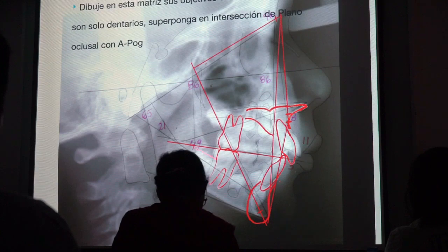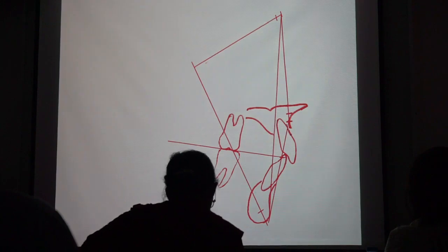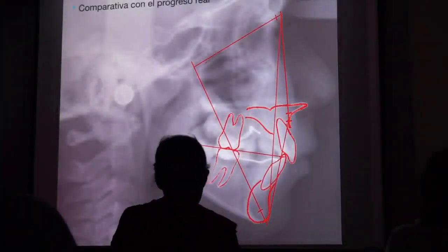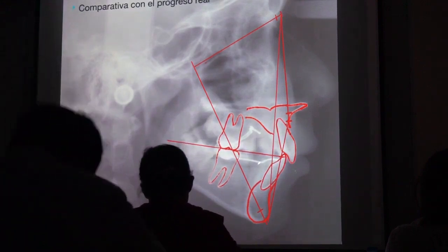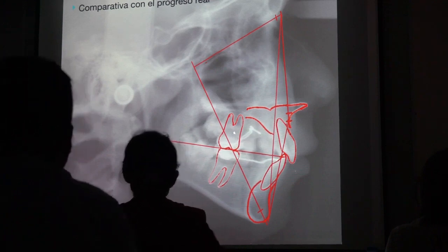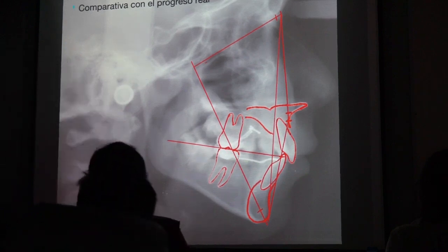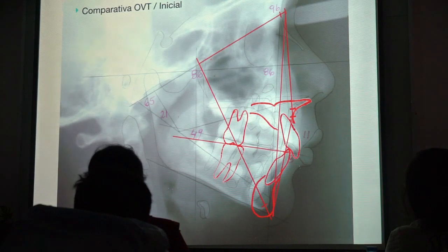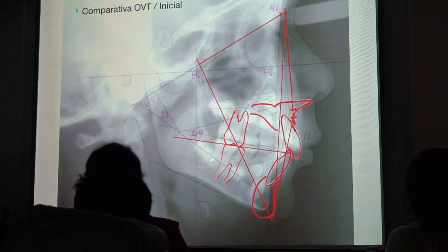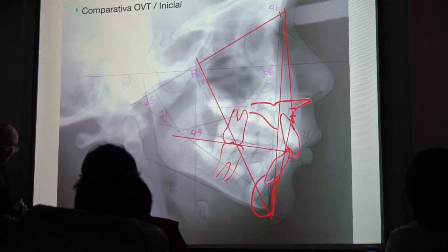Very nice. So this is a very simplified video that once you do the treatment, you can compare if it matches the results. In this case, this is the second case I present, and look how accurate it is because I put some kind of anchorage. So it's nice. I like it a lot. You can do it and see that it works. It's very useful to calculate your objectives and to think in biomechanics.